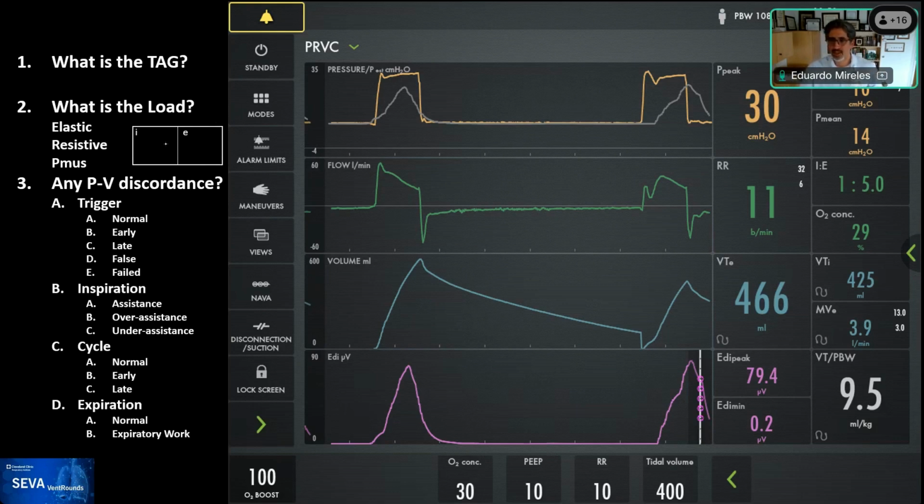I see that the team is starting to rapidly put the tag that identifies the mode as pressure control, CMV A. There are several clues within here, but the first one is the commercial name on the top, PRVC, and you see a tidal volume, which is the target tidal volume that we enter.